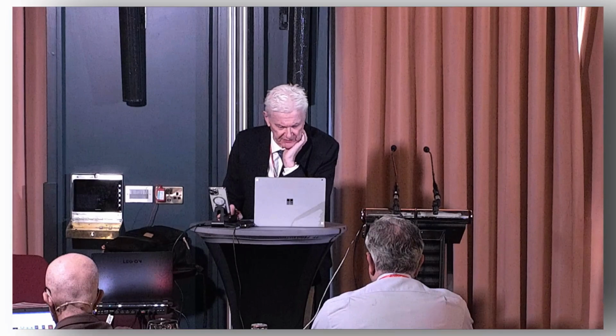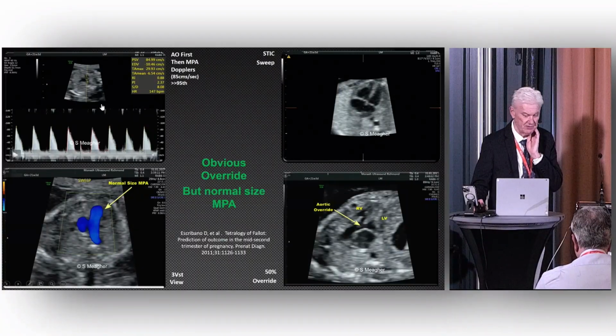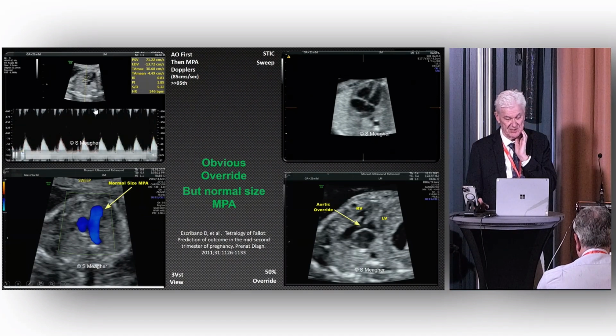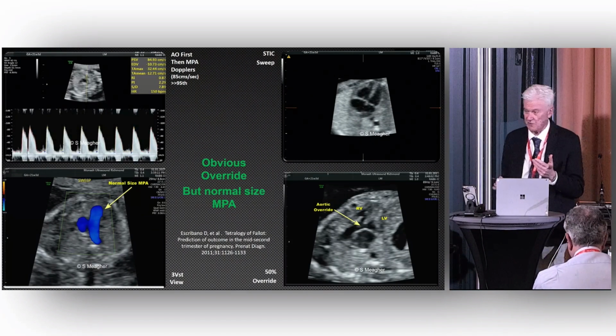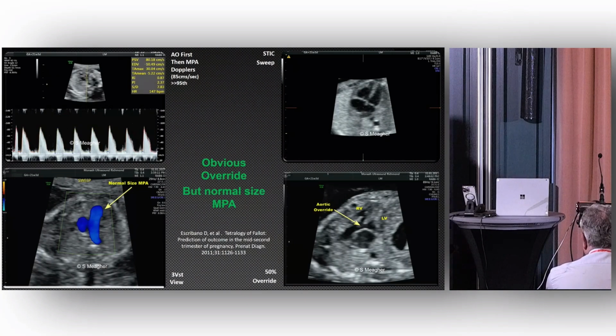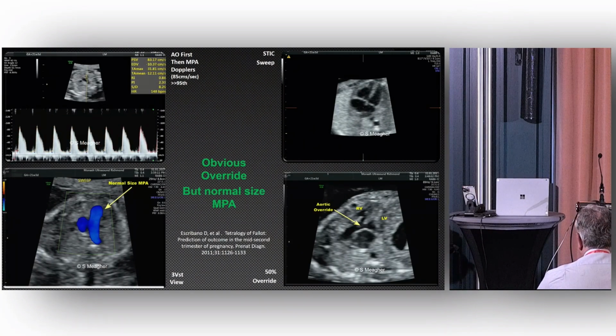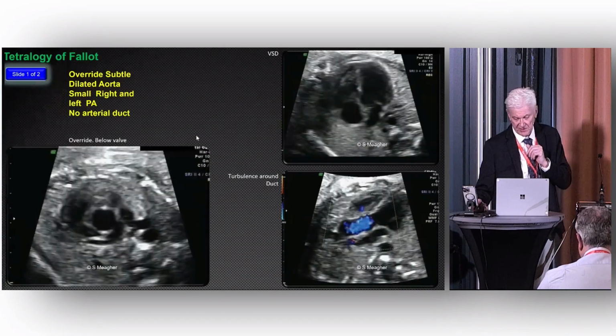So I look at the pulmonary artery velocities and I say, okay, the 100-centimeter rule, it's less than 100 centimeters. So when it's less than 100 centimeters, then the next step I want to know is what's the Z-score on this? But before I even Z-score that, I compare basically the vessels to each other. But look at the size of the pulmonary artery, it looks fine.